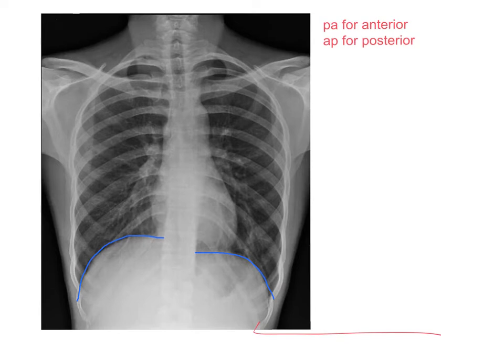When we're looking at this image, especially right through here in the heart shadow and lung markings and over here, it's very difficult to see rib fractures. They are not the easiest things to find. We start to lose bony trabeculae and sharper rib margins.